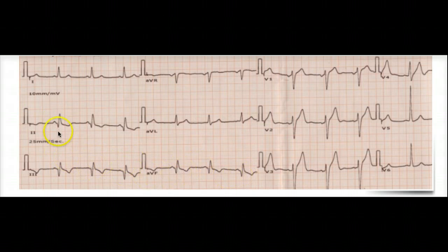The big Q wave starts from lead 2, so we can see a significant drop here, right? Because in this ECG the pictures are kind of small and Q waves are really small. So we start seeing it from lead 2, but it becomes really big in lead 3 and aVF. It's quite big and prominent in this ECG.